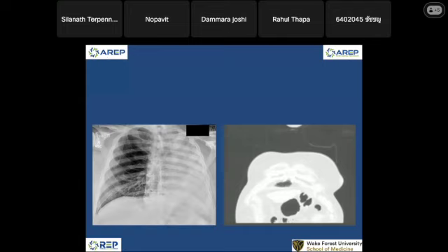Either prior surgery, maybe lobectomy or pneumonectomy, or the patient has mucoimpaction of the entire left main bronchus that caused obstructive atelectasis and lung volume loss, and then the atelectasis is pulling the heart and the trachea toward the left. So that's what I can guess from here.